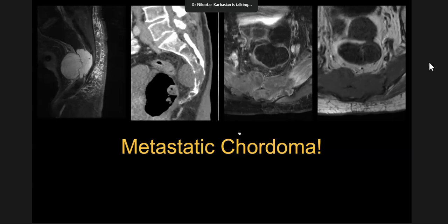Just a very basic small note about chordoma. You can see this sagittal T2 based MRI. This is a tumor arising from the sacrum in the midline, which is extremely T2 hyperintense, kind of fluid signal. It appears as a lytic or lucent lesion on CT, and it has, this is not a perfect example, but has a brisk enhancement. And I put the T1 pre and post to show that there's intralesional enhancement. So they can very much mimic hemangioma on an MR, but if we look carefully on those important notes, we wouldn't miss them.